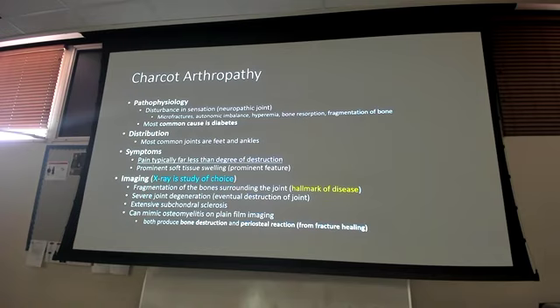I'm going to show you this x-ray in a minute, and you're going to be like, what are you talking about? How is it possible that they are having pain that doesn't look as bad as this x-ray looks like? These x-rays look miserable, but these patients don't feel the pain nearly as bad as the x-ray shows because their joints are neuropathic, because of the diabetes, okay?